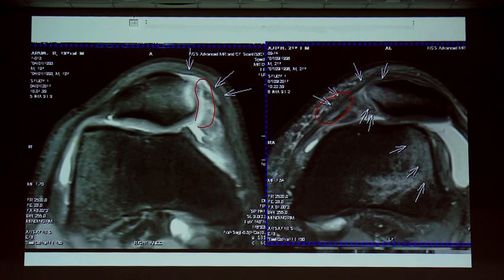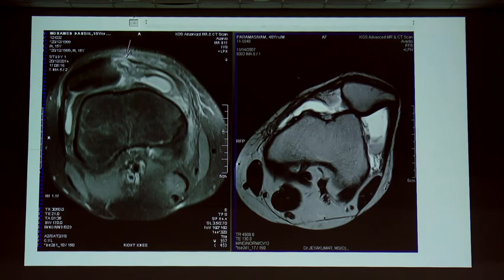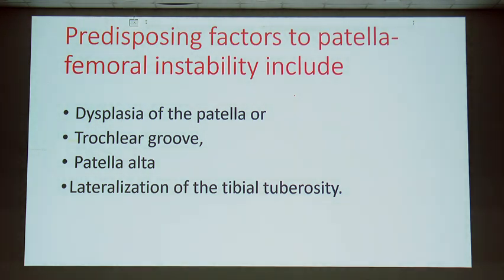So which portion is it, anterior third or middle third or femoral attachment site? You can see the femoral attachment site is freely floating. Apart from that, you can see the patellar attachment site also. And here you can see the patellar attachment site is absolutely normal. And you can see this femoral attachment site has gone. So a crystal clear mention of where this MPFL is injured, whether it is full thickness or partial thickness. All these things are very much essential.